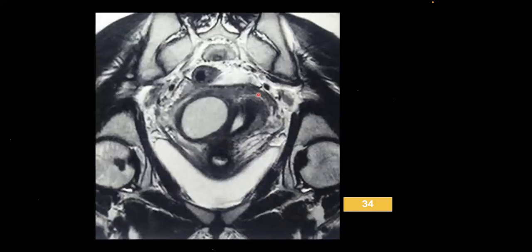Okay, now this one, somebody, you guessed it correct, that it's a uterine pathology, and somebody called it ACUM. What is ACUM? ACUM is an accessory cavitated uterine mass, but that will appear as a uterus, but it will show no connection with the uterus. Now, this is a part of the uterus only. So, this is not ACUM.